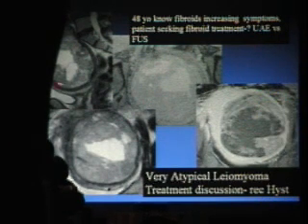Here you can see the fibroid on T2 weighted images. It's inside the uterus. It's fairly heterogeneous. We go to T1 pre and T1 post contrast. She's obviously lying on her back. We've got a fluid level or a hemorrhagic crit level almost in here. We have enhancing tissue afterwards. And this is very atypical.